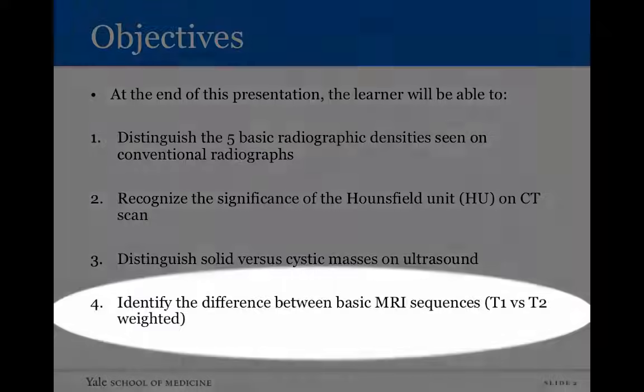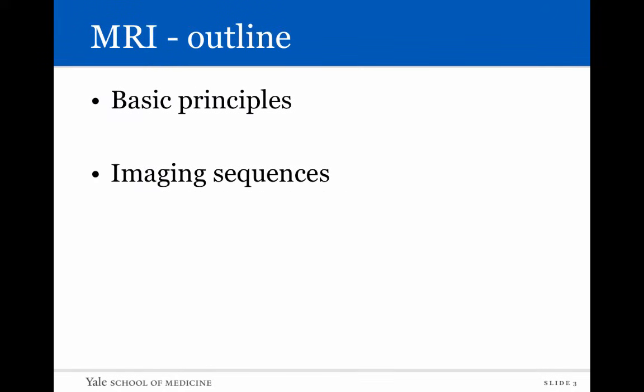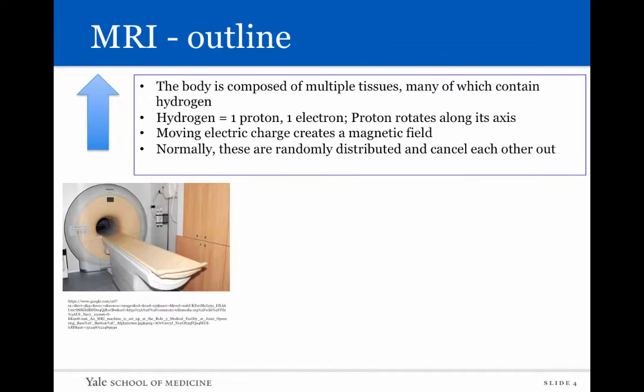The objective I'd like you to get out of this presentation is to be able to identify the difference between basic MRI sequences, specifically what a T1 weighted sequence looks like and what a T2 weighted sequence looks like. We'll do this by covering a few basic principles of MRI imaging, and we'll then dive into the imaging sequences themselves. So here are some basic principles for MR imaging.